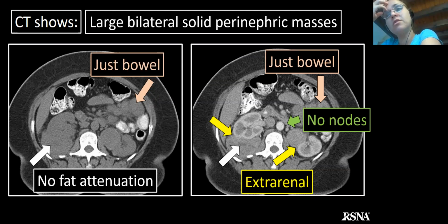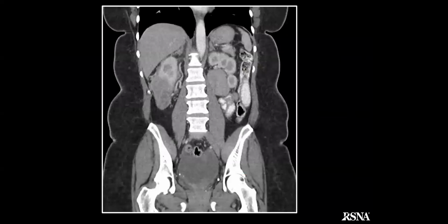How about anything that causes severe anemia that would maybe cause some weird extrarenal, what do you call it, hematopoiesis? Yeah, one of the things that could look like this, extramedullary hematopoiesis could look something like this. Maybe something causing severe anemia or bone marrow replacement. Yeah, I don't know of any seizure medications that do that. The bone marrow to me and the bone density look normal. I mean, it's just soft tissue windows, obviously. But yeah, that's a possible thing. We thought about that.